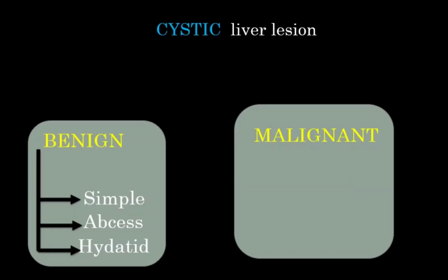By the way, before you start with the cystic lesions, the vast majority of liver metastases are multiple. It happens, but very uncommonly that we see a single liver metastasis. It can be anything: hyperechoic, hypoechoic, isoechoic, central necrosis, vascular, avascular. Anything is possible. So multiplicity is in favor of metastasis.